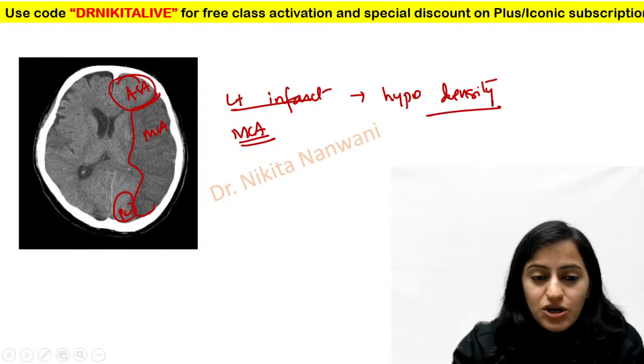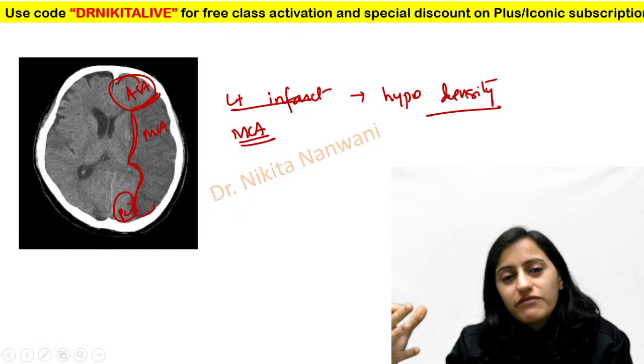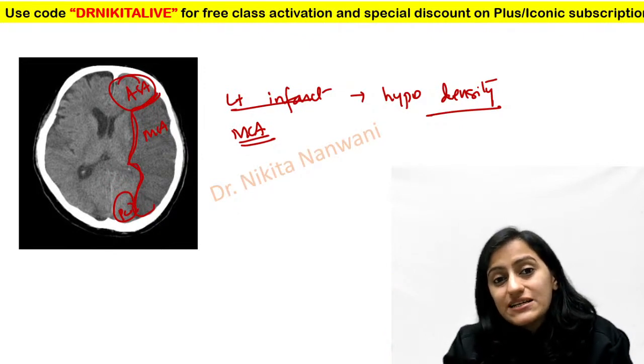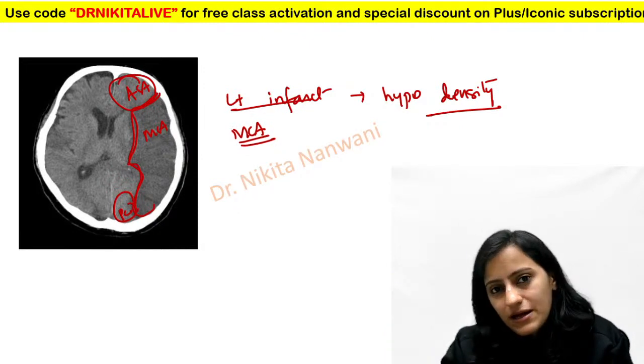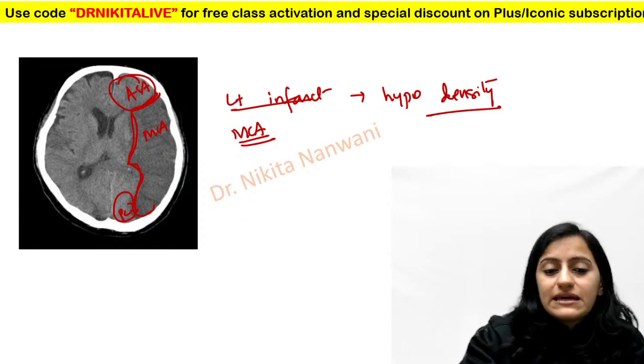Next one, this is not concavo-convex. This is within the brain parenchyma. Concavo-convex, biconvex, SDH, EDH is outside the brain parenchyma. Right, this is well within the brain parenchyma. This is a left MCA infarct.